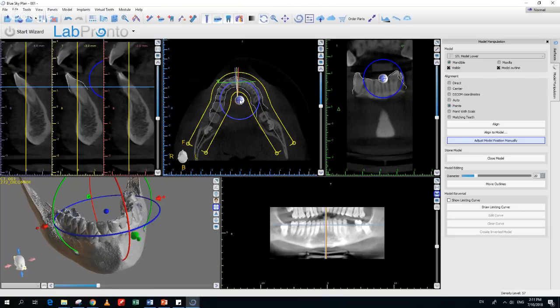If you hold down the Alt key, instead of moving the model in any of the 4 directions, then it rotates the model in any of the 4 directions. So if you have a really problematic merge and you're doing it manually, you could grab and drag the model, you could use the widget, but you could also use the keys on the keyboard down to the pixel level to nudge the model over.